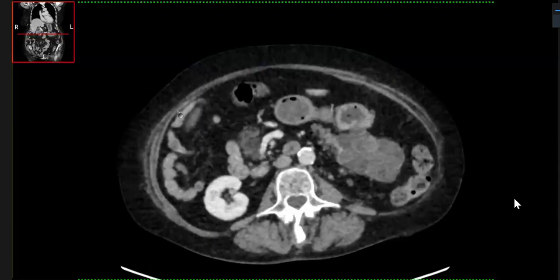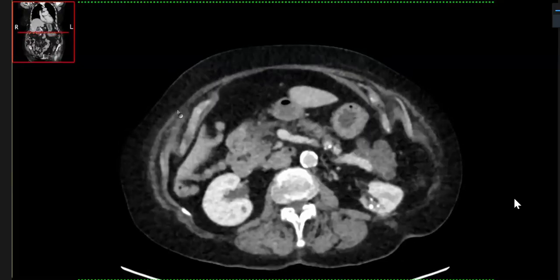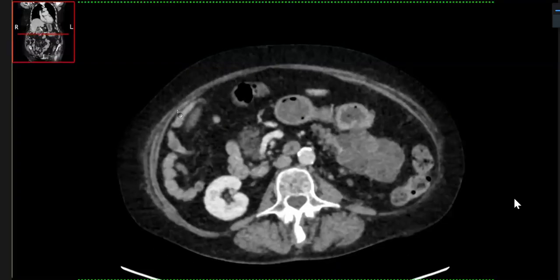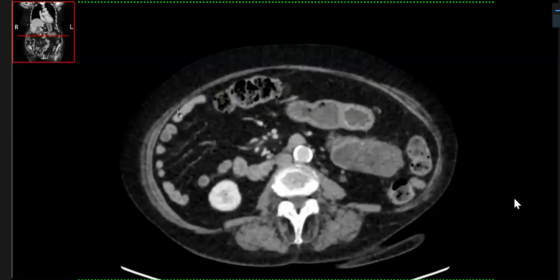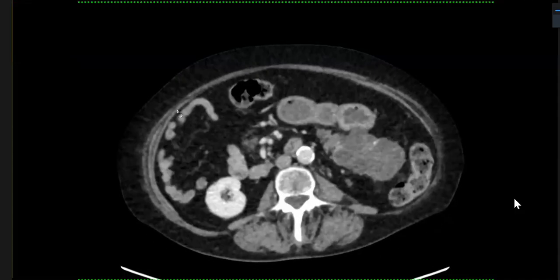So what is your conclusion? My conclusion is a pancreatic cystic tumor involving the tail and distal body of the pancreas. Sir, can you again go to the main? I do not see any vascular thrombosis. I see some specks of calcification in tiny cystic areas within this lesion.